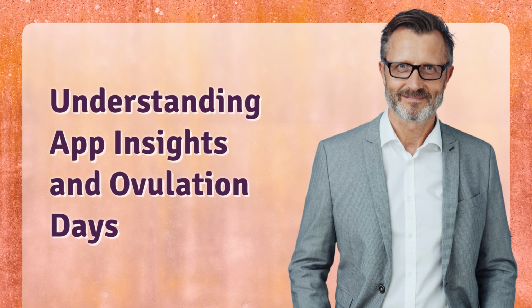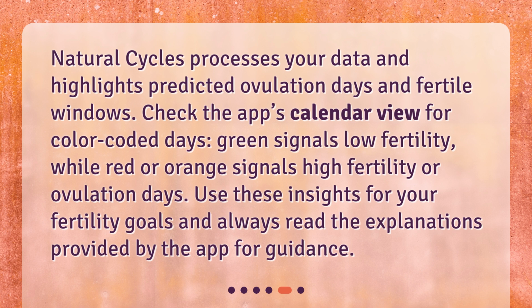Understanding app insights and ovulation days. Natural Cycles processes your data and highlights predicted ovulation days and fertile windows. Check the app's calendar view for color-coded days. Green signals low fertility, while red or orange signals high fertility or ovulation days. Use these insights for your fertility goals and always read the explanations provided by the app for guidance.